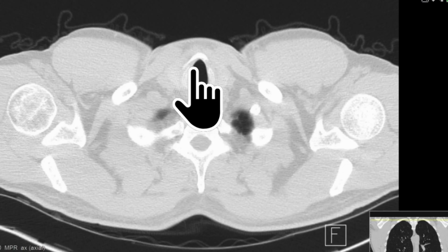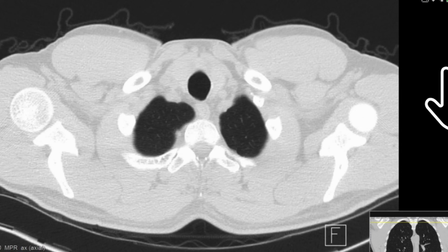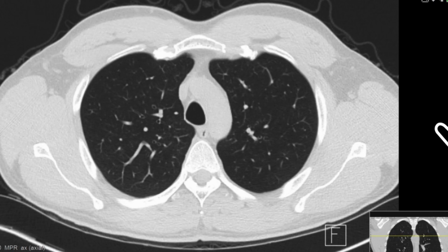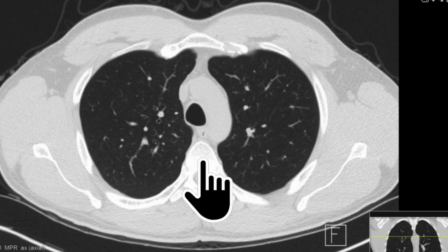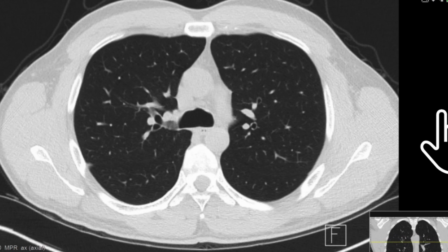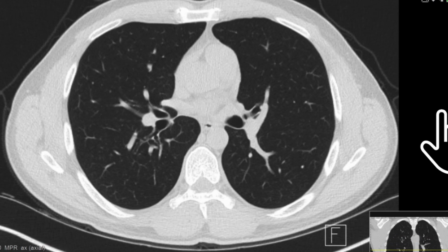Let's go back up high again. Let's follow the trachea down and see if we can see any sign of the esophagus. So it's very indistinct. Oh, a little bit of gas in it there, look. Keep going down. So we're watching the trachea, the esophagus is here, the vertebral bodies, and the descending aorta is going to appear here. Let's keep going. Oh, you still got an eye on it? Can you still see it? Oh, it's opening up now. So that's a good one, isn't it?